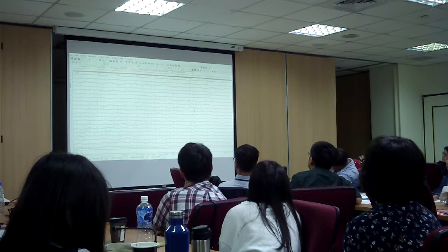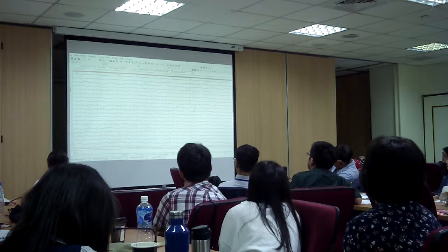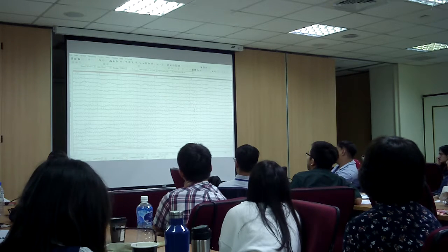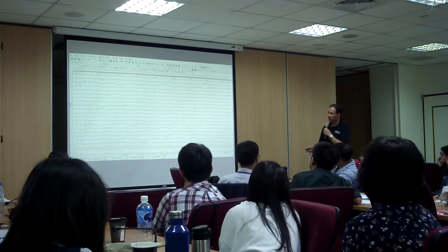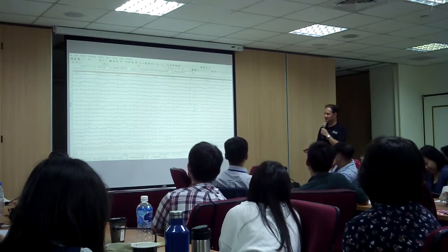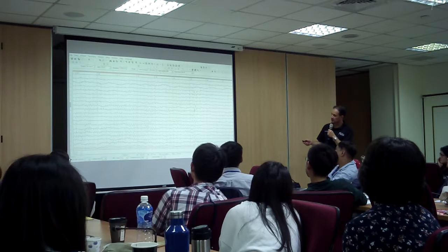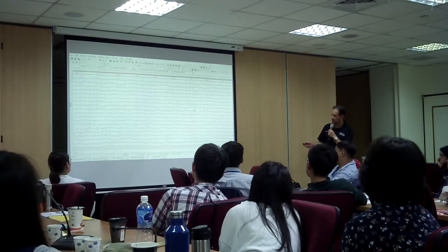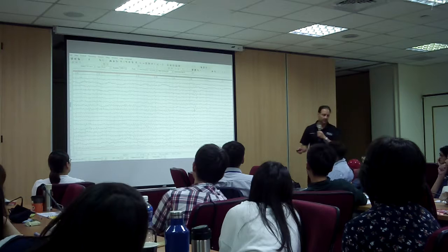So F7, F3, and T3. Do you see anything there? Yes? No? We have no idea? Notice that, and notice that. See that little activity right there? Okay, that's significant. I know it's blending in, but it's significant.